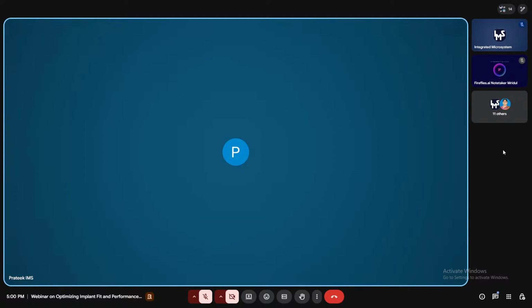Let me open the software again. Pelvis icon. Wait.